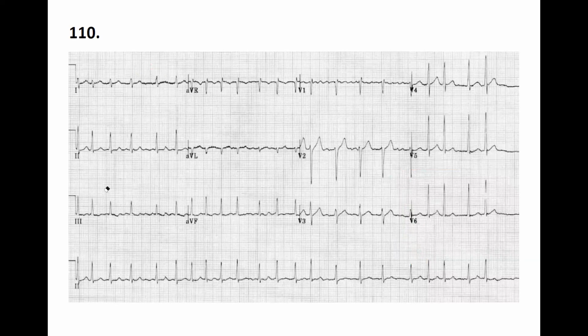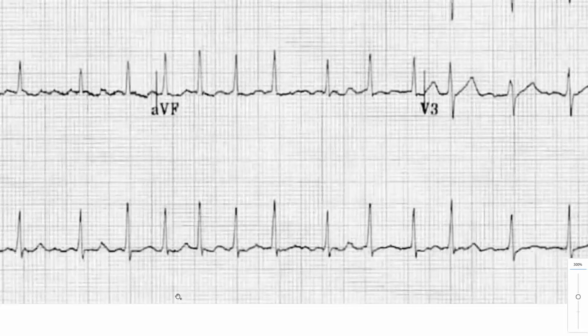No. Why do you say that it is positive and negative? Oh, okay. Basically, if you are looking at these leads, let's look at, for example, lead number 2 at the bottom. Well, that's a T, that's a T, that's a T, that's a T. These can be some kind of wave, what we do have here, see, or maybe here.